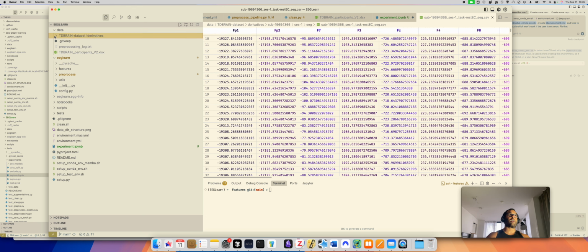Yeah, it is everything in parallel. So even if you're doing just two files, there's a small startup cost because you're setting up the two processes. But if you're doing 1,000 of these files, that cost is negligible and the speed up you get is valuable. So everything is handled in parallel. Yeah, so now you have everything cleaned.